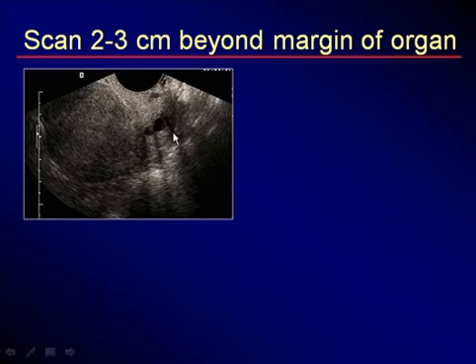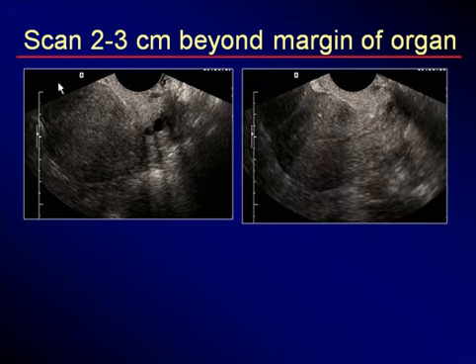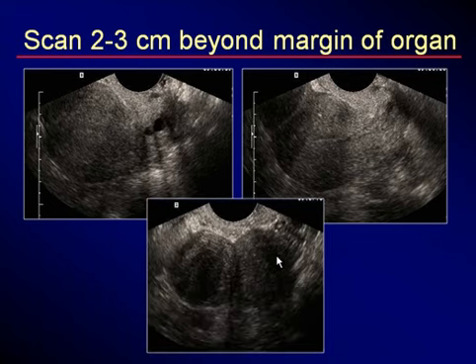Here's a uterus that just about makes it into our field of view, but the whole anterior part here, caudal aspect, are not well imaged. It just so happens that there actually is a mass sticking off the fundus of the uterus, and this was a pedunculated myoma that was pressing onto the bladder and then causing dysuria in this patient. Could have been missed.